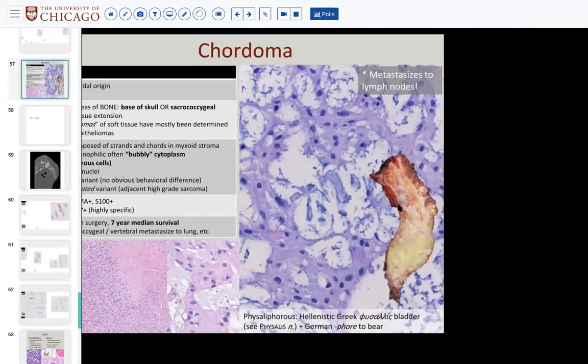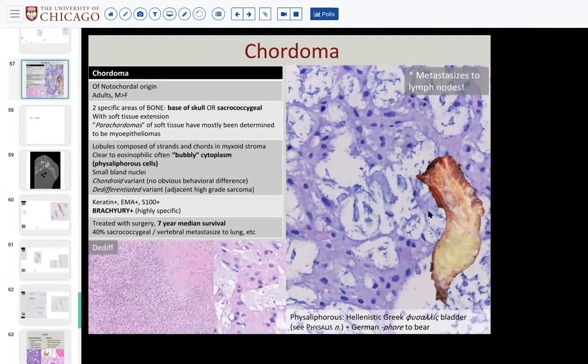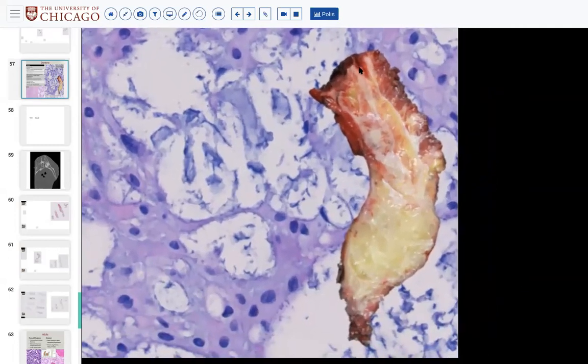I think some of you were here a couple years ago when Peter Nielsen came and spoke about chordomas. Mass General is the chordoma center of the US, and a lot of these get resected there. This gross image is a nice tip of the sacrum with expansion into this lesion, which looks almost fatty or glassy or myxoid or gelatinous on gross.